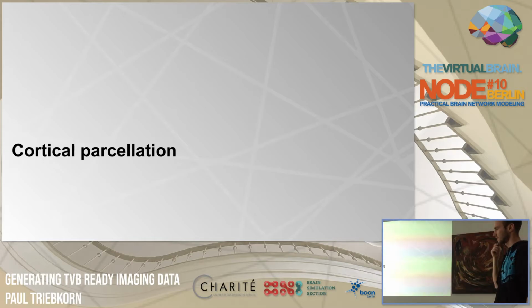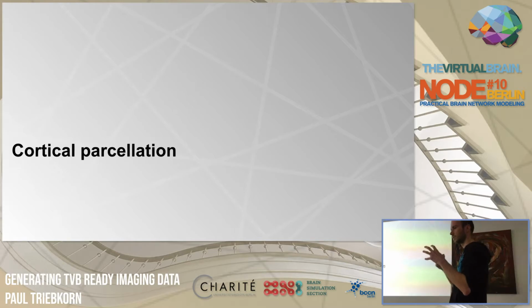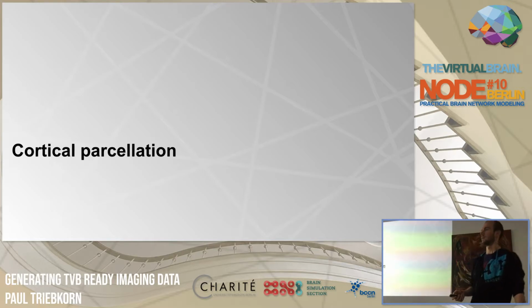Cortical parcellation: there are several brain atlases out there to group the cortical surface into different functional areas. Some are volumetric based, maybe defined in MNI space or on some template. What people then do is they register the subject's structural scan with the template, and then just copy the region labels from this template. As I said, it's harder to register in 3 dimensions than in 2 dimensions.